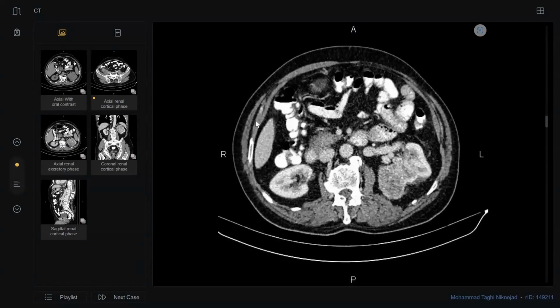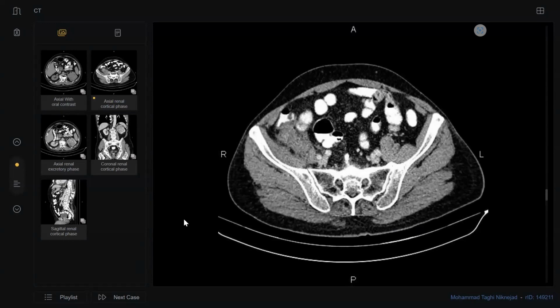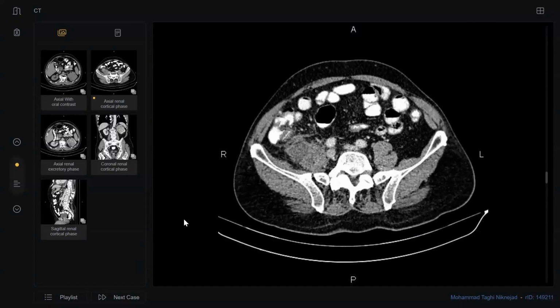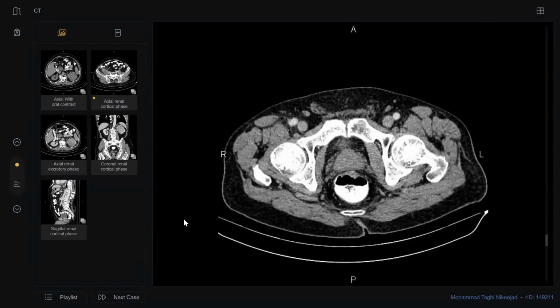It may be a cyst or a deposit, we don't know. And here, the appendix is very large, and I think it may cause a localized abscess formation. So this is a double pathology: acute appendicitis and metastatic left RCC.